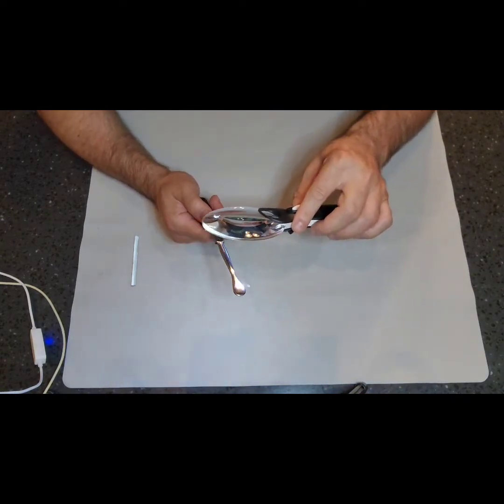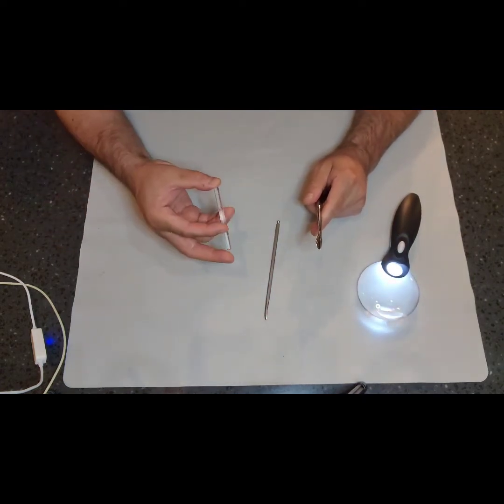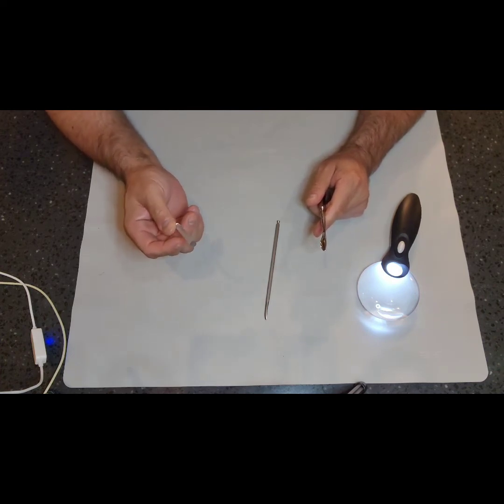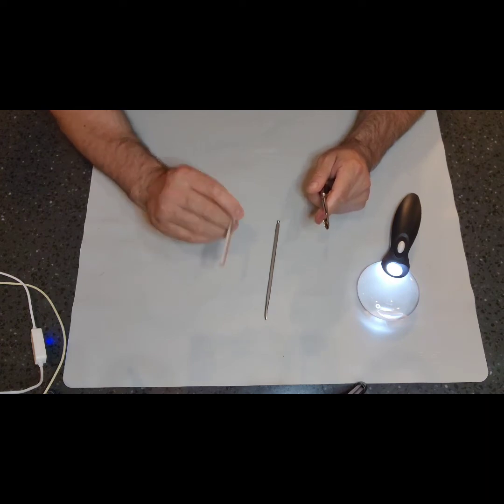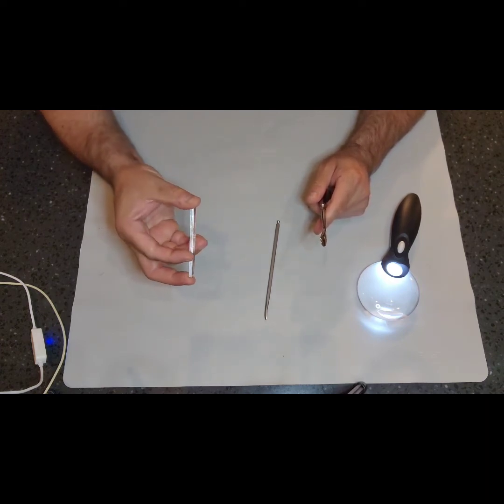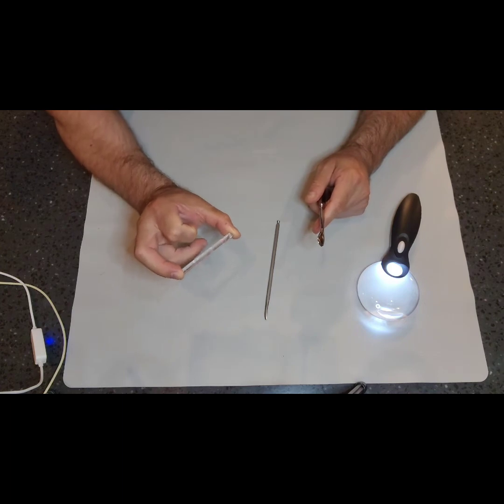Make sure it's sharp. And would I do a sharpness test on this? I actually would. And here's our handy dial. Thank you for pointing this out. It is such an unutilized testing tool in our field. But again, I want to show you guys these are sold singularly or in kits. Check with your repair company to see if you can get them. Please do not hold this rod as such.